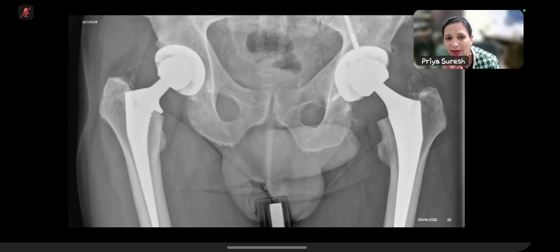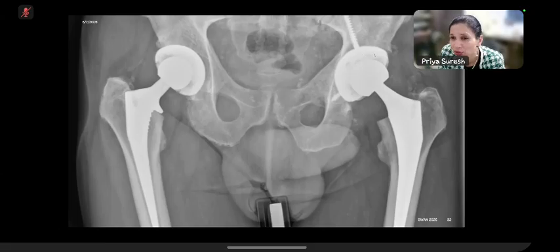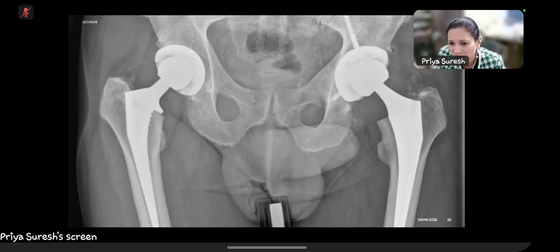So then they went on to have bilateral hip replacements. Again you can say what kind, because it's cementless. It's the press fit. Okay, it's cementless and it's total, and it has a polyliner, because of this lucency that you can see. Similar here, but it's also reinforced with the acetabular component, because there was so much lysis there. That's why they have done that, and they have done a little bit of bone grafting here to try and fill that, because of, again, the osteolysis that the patient had.